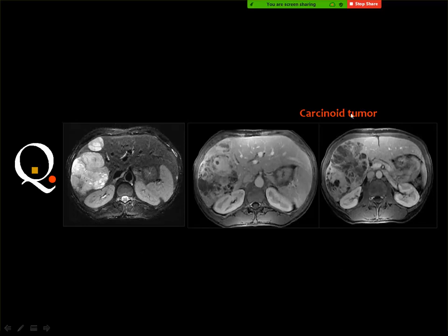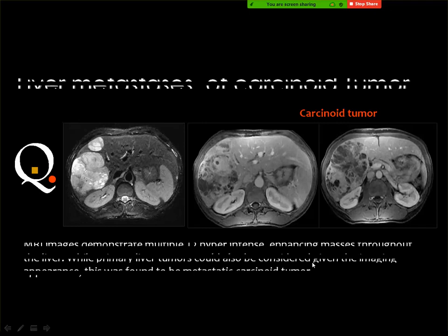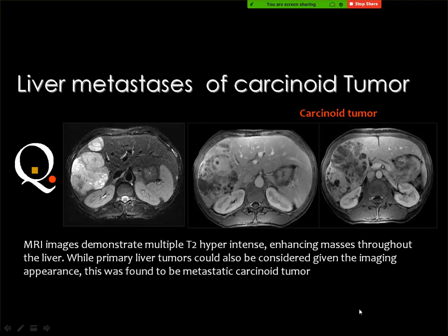Yes, and I will emphasize once more, I swear that if you know that the patient had a primary malignancy, you should consider it. And you say that these are metastatic deposits until proved otherwise. If you are asked about the differential diagnosis, forget about this and say this is multifocal hepatocellular carcinoma or lymphoma or metastasis.